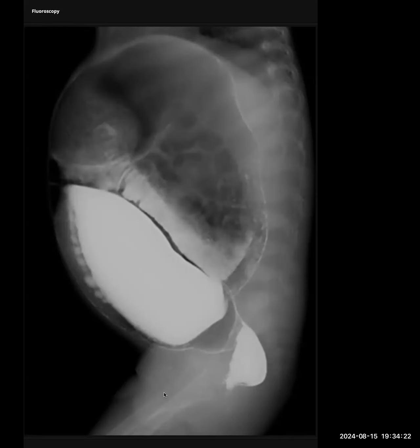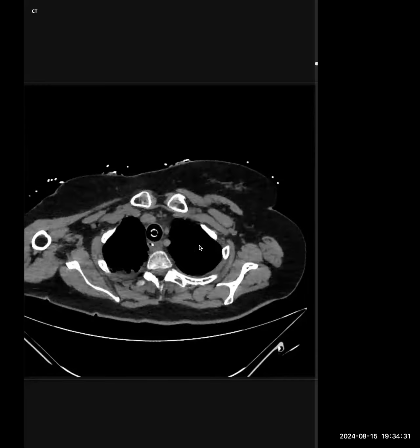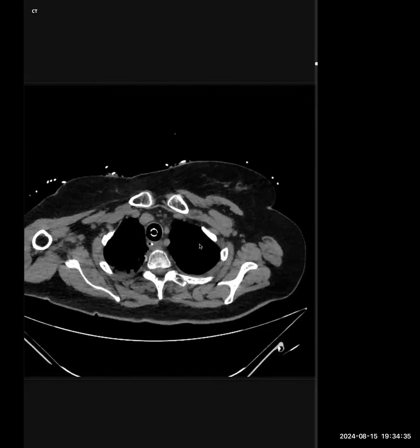Five minutes remaining. Okay. You can't get control. Okay, so I'll just scroll from the top to bottom then. Is the speed okay for you?